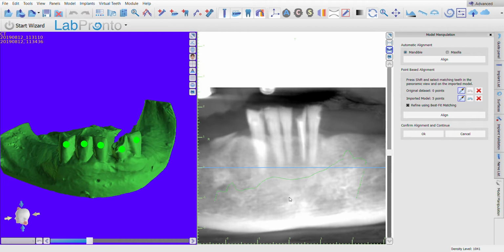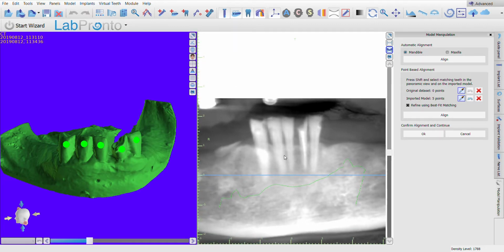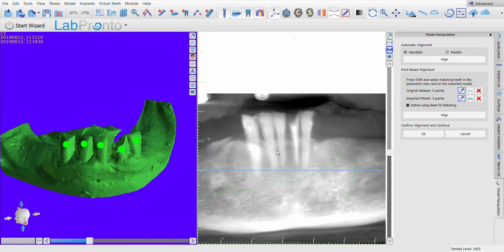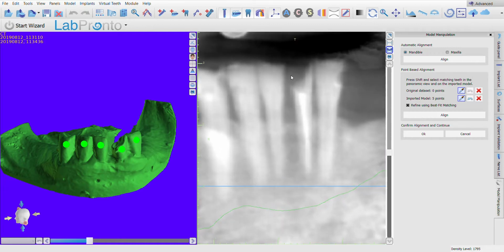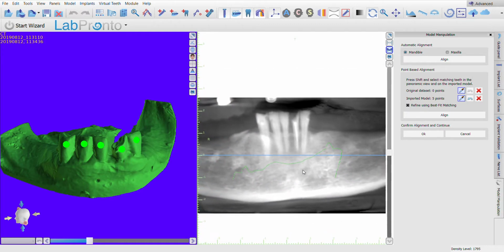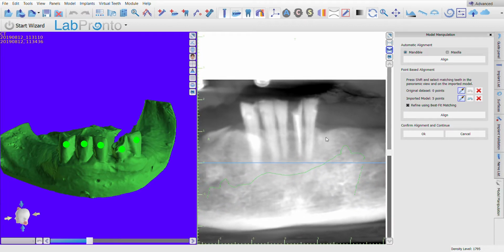So having said that, in order to move the image, I press down on my scroll button and then I can basically move the image in its window. If I want to maximize, I right click on my mouse and push the mouse away from myself, and it maximizes. When I bring it closer to myself, it goes back and minimizes. So that's how you maximize and minimize your images and how you move them.